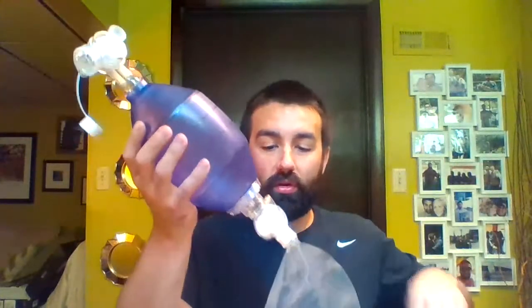You have your oxygen tubing hookup. This will hook up with or without a Christmas tree, due to the round shape there. We want to run this at 15 liters a minute, all right? These come in a bunch of different variations. Sometimes it's a big clear bag, sometimes it's just a piece of corrugated tubing that goes around, but that's our reservoir. It allows us to give 100% oxygen. You don't need to run this at flush in order to give 100%, and flush on this thing makes it where you can't hear and it'll drive you crazy. 15 liters a minute, as long as you're hooked up to a reservoir and oxygen, you're all good. Back here, there are one-way valves that allow oxygen to only go into the bag.